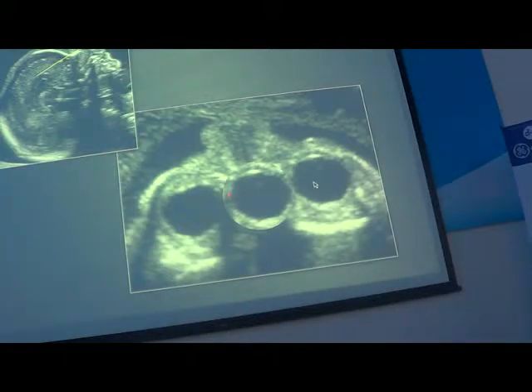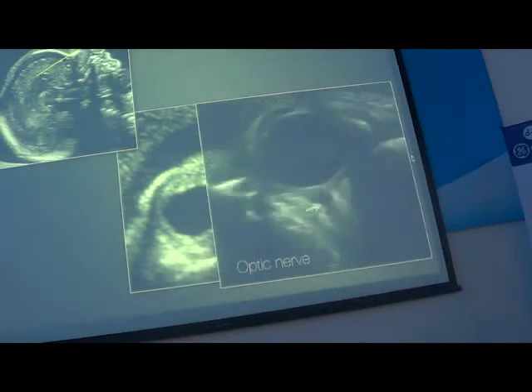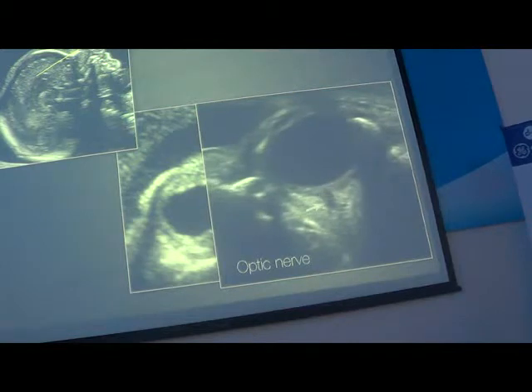Tuy nhiên phương pháp nhanh chóng nhất mà dễ nhận diện nhất các cái trường hợp mà mắt cách xa nhau hoặc là quá gần nhau, đấy là khoảng cách bờ trong của hai mắt là phải nhét vừa một cái mắt khác. If it's more, that means you have a hypertelorism. If it's less, that means you have a hypotelorism. Trong trường hợp mà mắt cách xa nhau thì các bạn có thể để một con mắt khác vào đấy mà còn vẫn cảm thấy rộng.